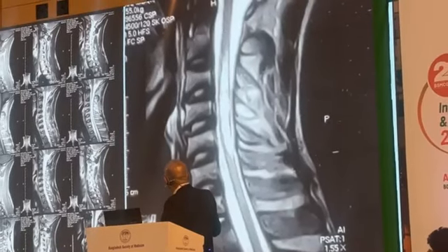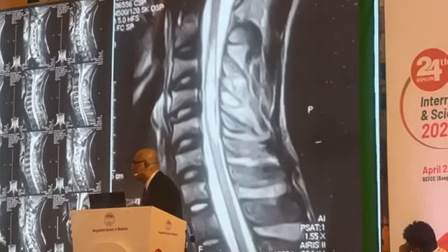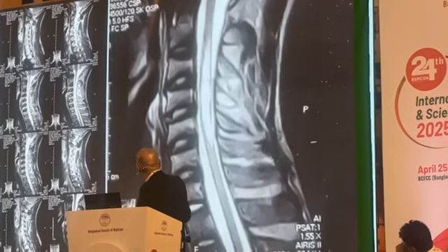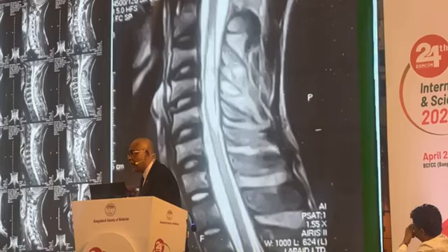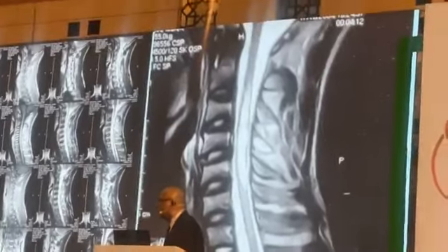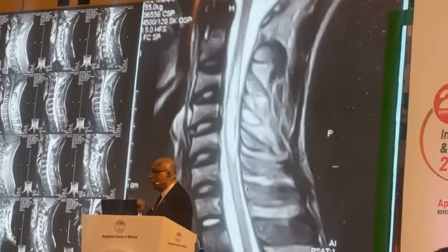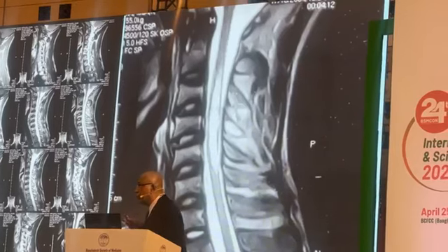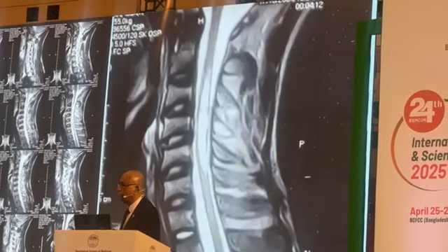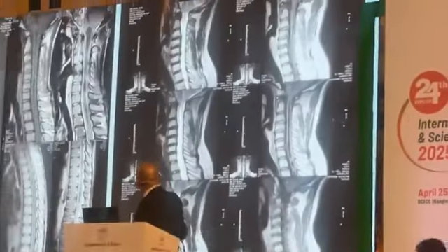Unlike that one, can you see a similar lesion, but much elongated, a single lesion. It has involved more than 2 segments of the spinal cord. This is another inflammatory demyelinating lesion, or myelitis, but this is unlikely to be MS or ADEM. This is likely to be the classical post-viral transverse myelitis that we see.